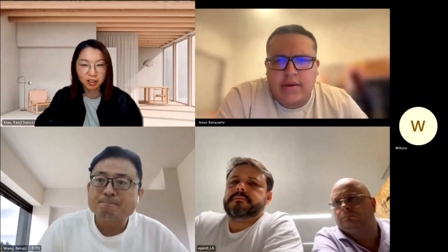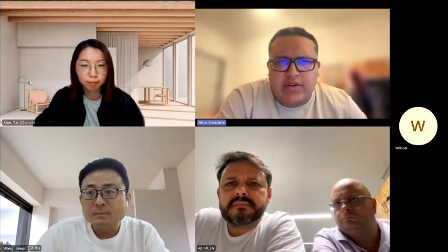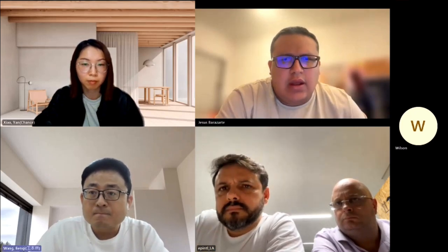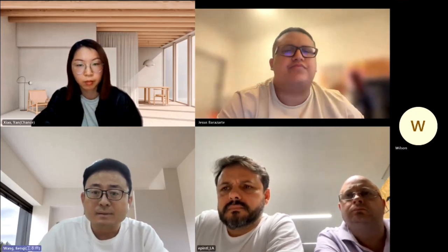Thank you so much, Ben. Let me ask you something. So we agree that we can take around 4,000 or 5,000 points, but at that moment there is going to be some lagging on the system. Also, if I understand right, if we have many points in the same position, the first one is the only one that will be displayed, and the others will not be displayed, right? Yes, yeah. Okay.